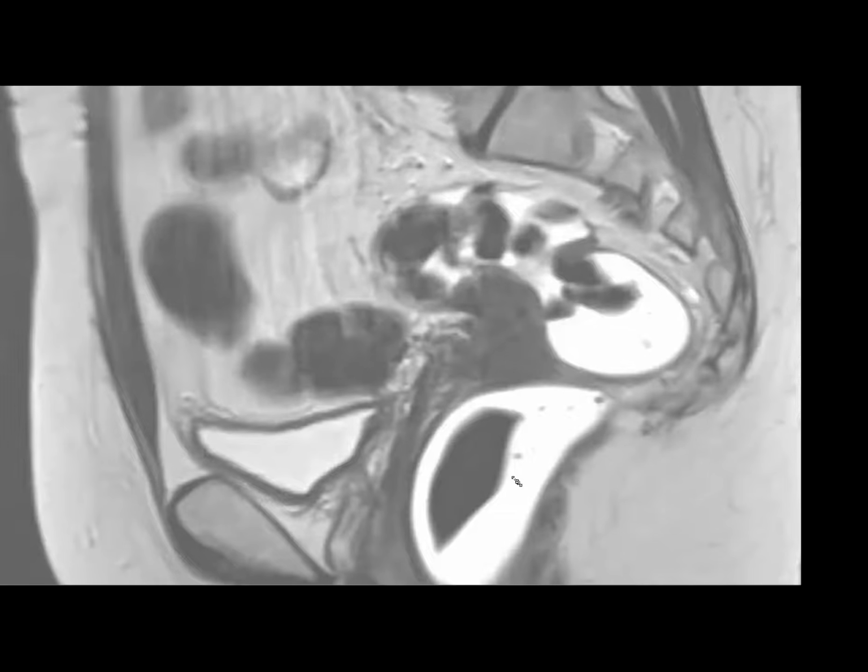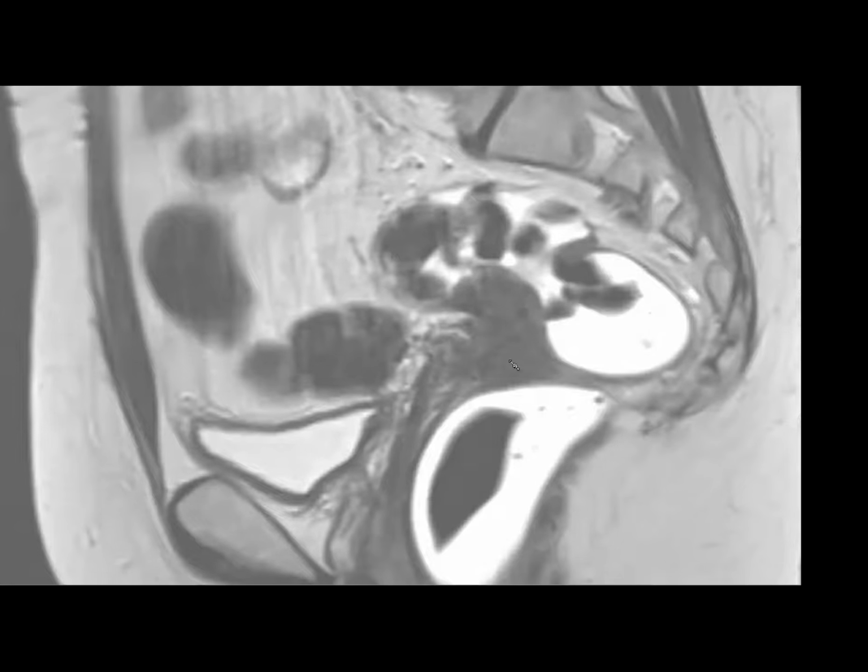Endometriosis. Yeah, good. So it was like a 40-year-old female, and we thought this looked good for the mushroom cap sign, which I think Nelly had shown us before too. Teresa and Regina were telling us about the resection of these lesions. So we were pretty convinced that this was endometriosis with a mushroom cap sign. And what I learned from Regina is that if it's involving less than 50% of the circumference of the rectum, then the GYN surgeons can do a discoid resection and just remove it and then seal it up. But if it's more circumferential, they need to start involving colorectal surgeons.